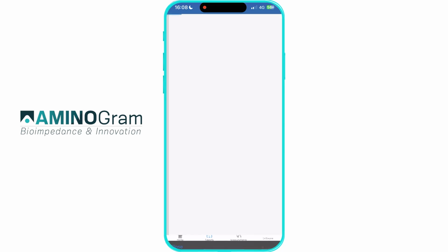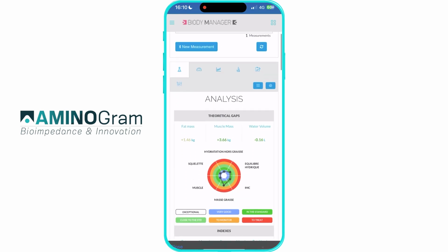Congratulations! You have unlocked the potential of your BIODY.